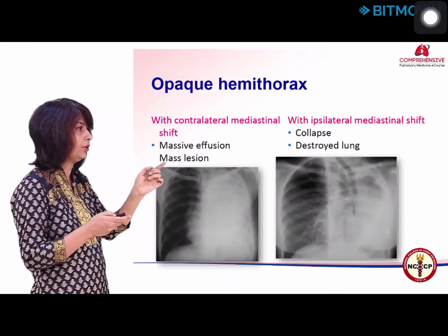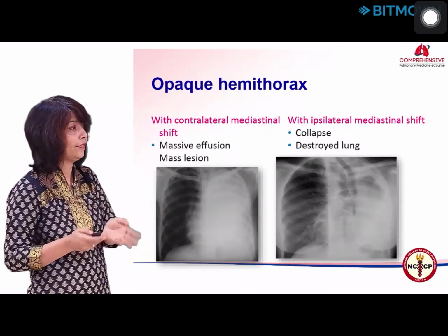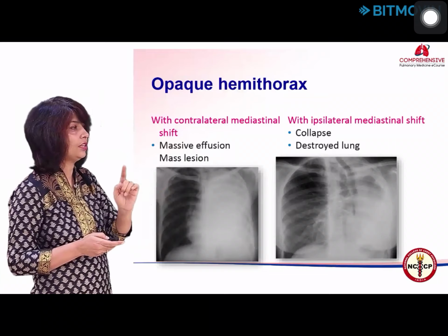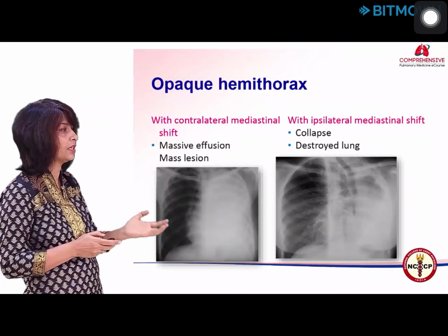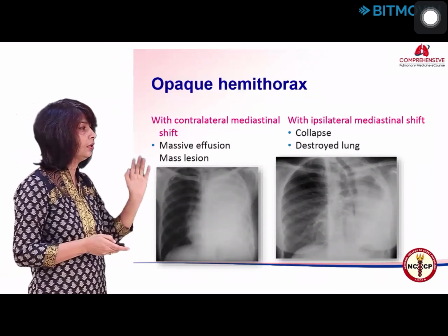So see what happened to the hilum. The hilum has also traveled with the mediastinum and gone to the left side. So I know that is compensatory hyperinflation of the right lung because I see a reoriented right hilum. So this is the pull type.